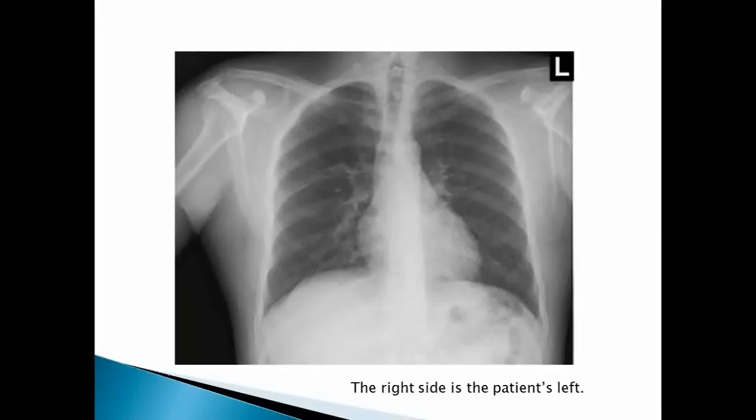You also might see breast shadows. So you can see down here, these shadows. You might be thinking, oh my goodness, they have something in their lung, because it's all kind of whitish here, but this is their breast shadow. And somebody with a really heavy breast, sometimes it's going to be even darker than that.